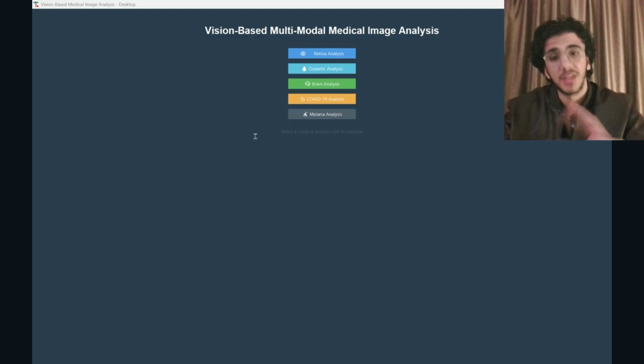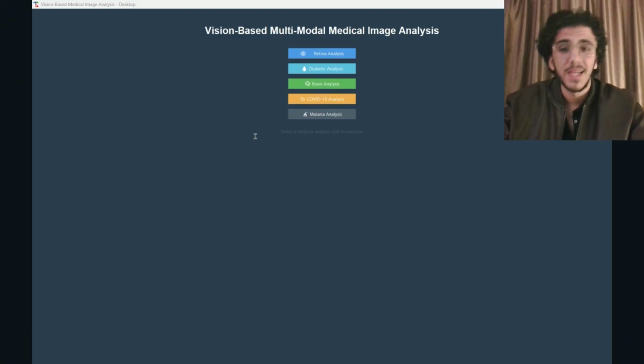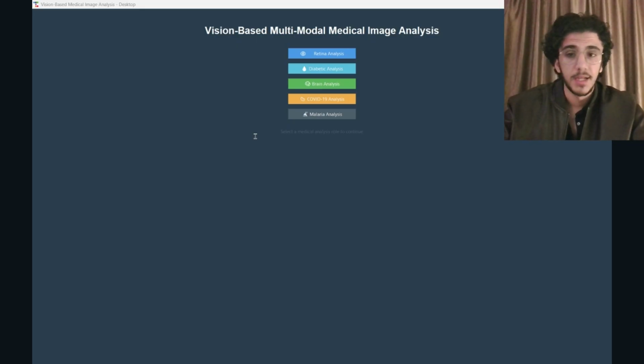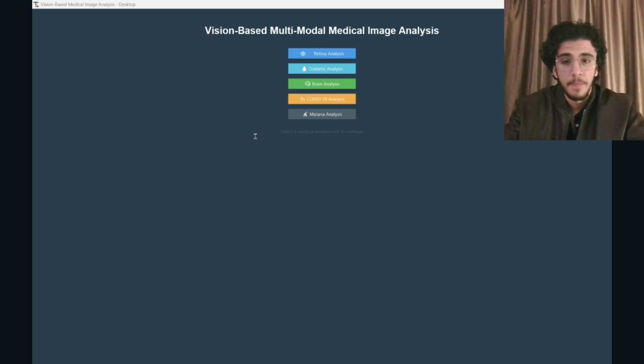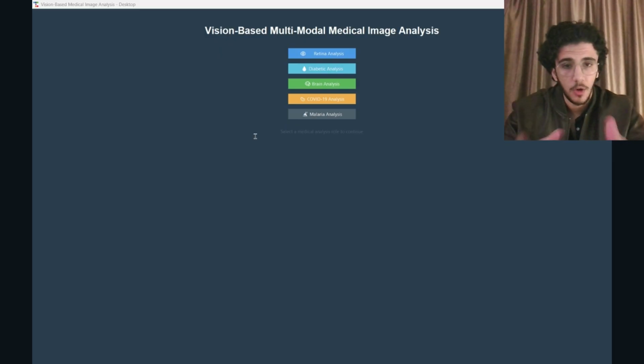Task 1 is traditional analysis with feature extraction. Task 2 is deep learning methods using multiple AI models. Task 3 is direct comparison of both methods. This is not just code, but a full interactive medical portal with login, navigation, zoom, and visual options.